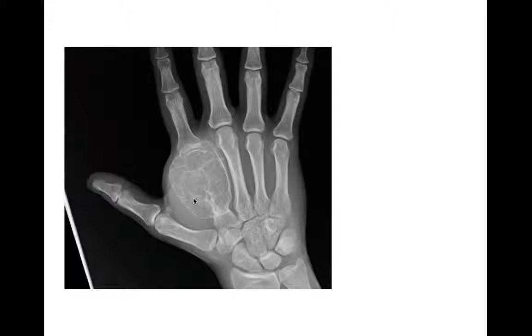Next case is a radiograph of the hand. We have a geographic expansile lytic lesion with a narrow zone of transition, non-sclerotic border, which is really involving almost the whole of the second metacarpal. It extends to the articular surface here. Don't see a pathological fracture in this case. Two primary differentials here would be a giant cell tumor and an aneurysmal bone cyst. This turned out to be a giant cell tumor. In this case, I think an aneurysmal bone cyst could be an equally good differential to consider. Those would be the two main differentials in this case.